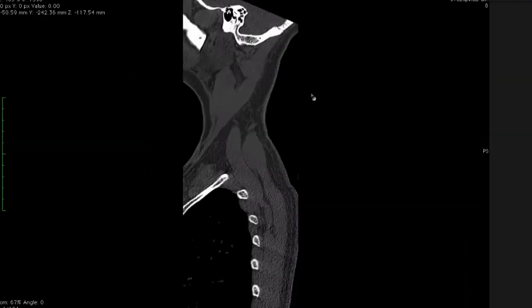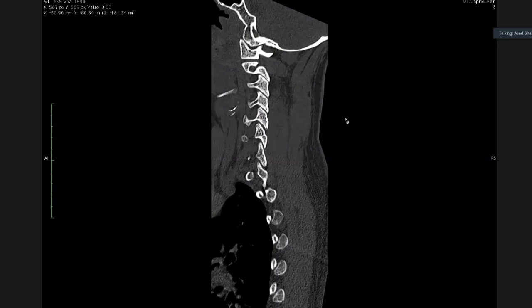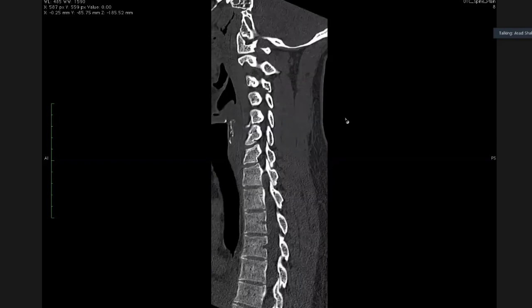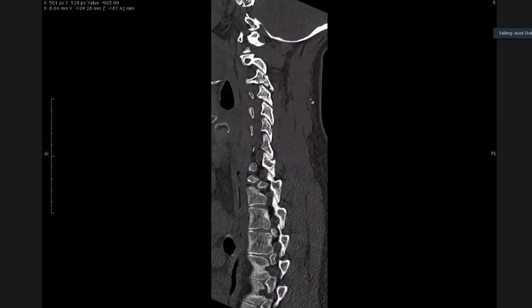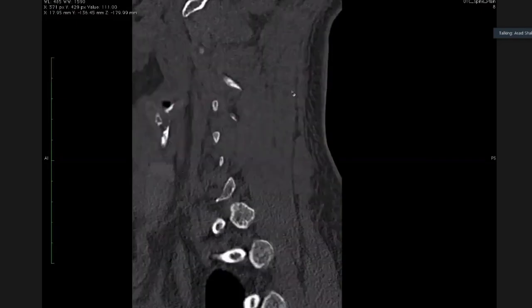Sometimes that generosity in radiology is not very helpful for reporting radiologists, but that's how it is. I'm scrolling. Okay, right, sir, I got it. There's a cortical break. Just hold on there. I'm going to scroll for all of you, and then we're going to talk about which fractures we see. So these are the sagittal, parasagittal images.